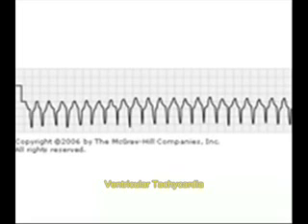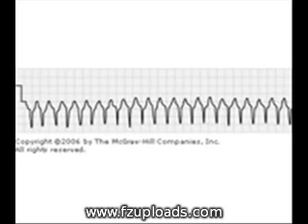Now this is ventricular tachycardia. In ventricular tachycardia you see PVCs, that is premature ventricular contractions, 3 or more, and the QRS complex will be very wide. Whenever you see this, you should think of ventricular tachycardia. That needs to be treated. If it is otherwise it becomes serious.